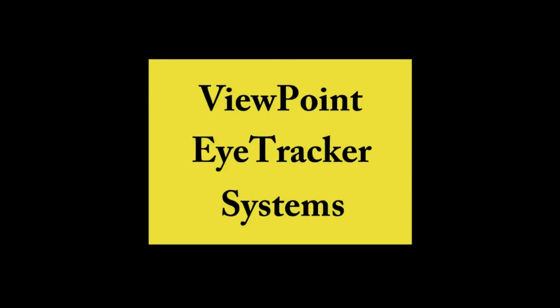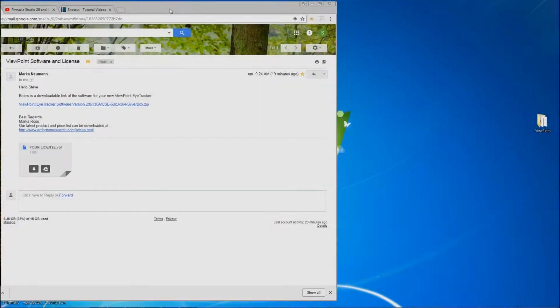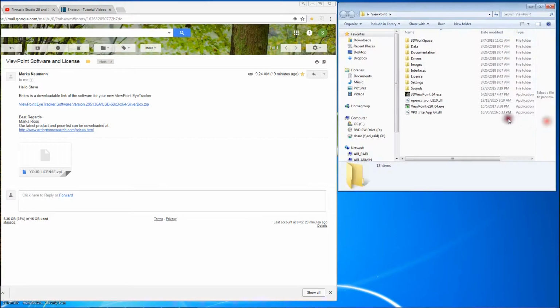Here are the installation setup procedures. Download and install the ViewPoint software onto your desktop from the link that was provided to you. If the software license was provided to you separately, please drag and drop the software license into the license folder inside the ViewPoint software.